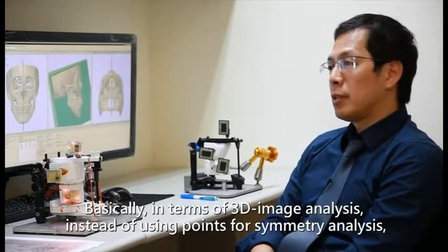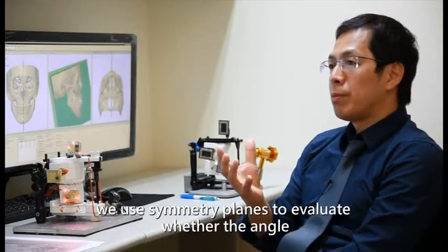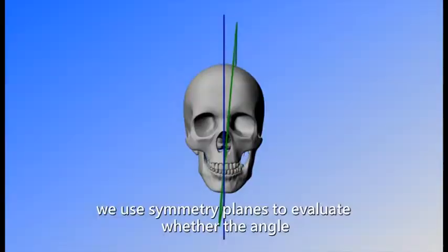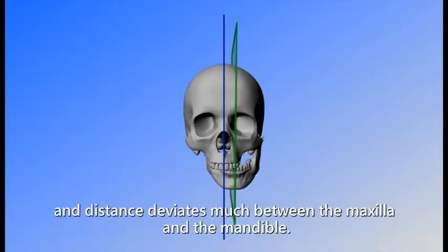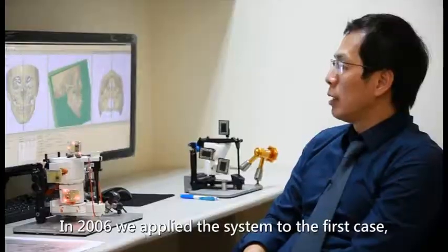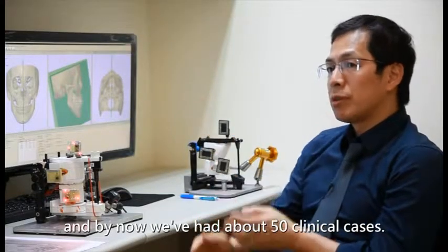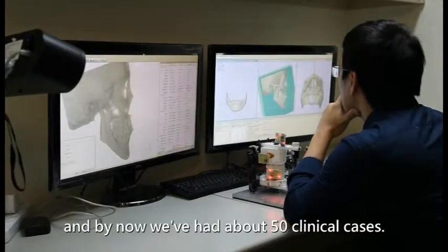Basically, in terms of 3D image analysis, instead of using points for symmetry analysis, we use symmetry planes to evaluate whether the angle and distance deviate much between the maxilla and the mandible. The third part is the Navigational Articulator System. In 2006, we applied the system to the first case, and by now, we've had about 50 clinical cases.